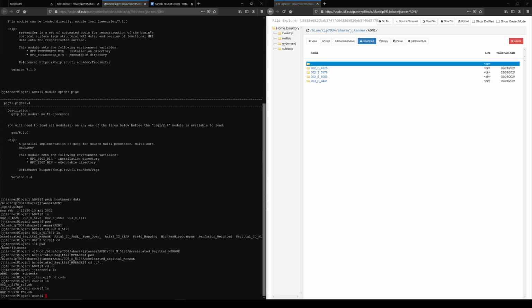So what we can do is a little loop. I'm going to do for subject in 002_S_6053 003_S_4441, do.